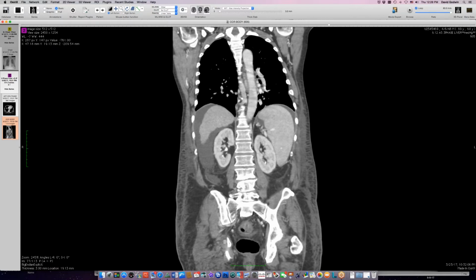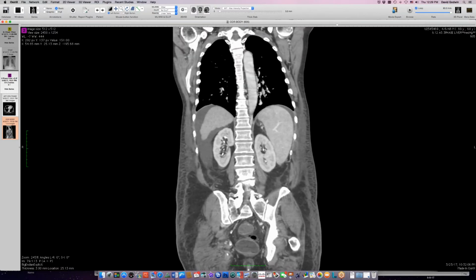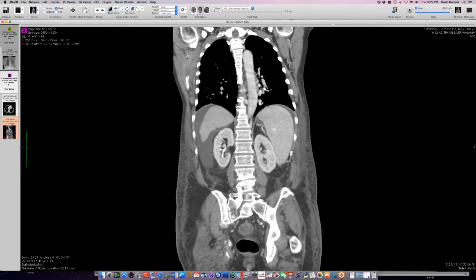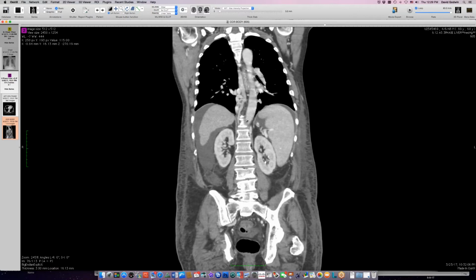This one is a little more peripheral. It's not the main part of the vein where the connection is, but a little bit lower, to a more peripheral branch, which ultimately leads to the inferior pulmonary vein higher up. So here's the connection back up. Yeah, so another case of varices that managed to get into the lung or the lung circulation. It's a nice example of that.